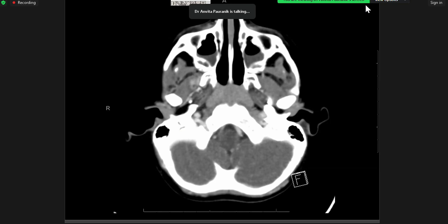So coming to closure of this case, there are a few unanswered things. When we read the scan, this child was 4 years old, and he had presented with fever, headache, lethargy, as I said. So our differential was early subdural empyema, and this can be hard on CT because you don't have the diffusion weighted sequence, right? But because of the history and because of the associated changes, that was the main differential.